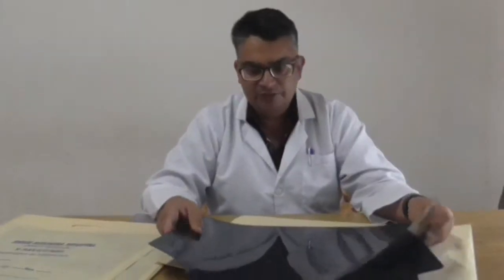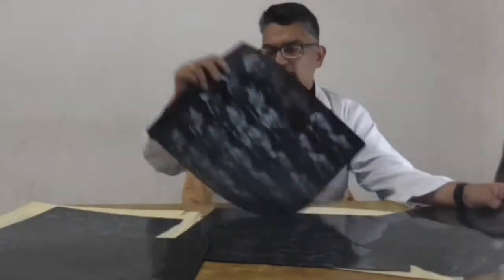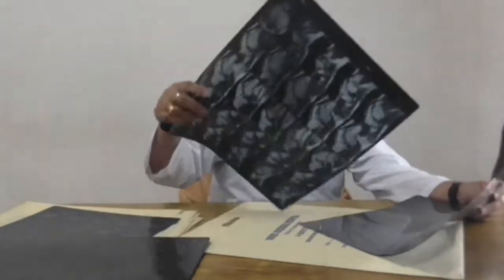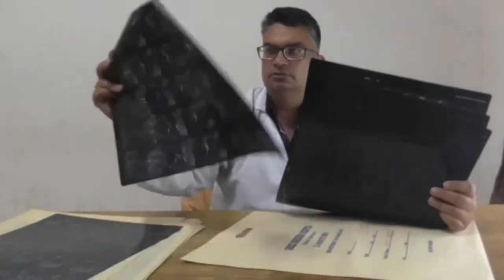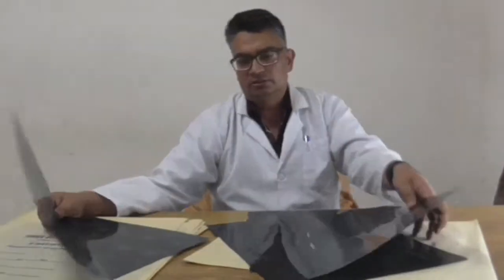When we get an MRI in our OPD, I take out the films and try to see them. This is our sagittal section film. This is our axial film. This is our coronal film. And then I have one more sagittal film and then one more sagittal film. So what I do is put them into sequence: three sagittal films, one coronal film, and then one axial film. This is the sequence in which I read my MRI. I first see the sagittal film, then the coronal film, and then the axial film.